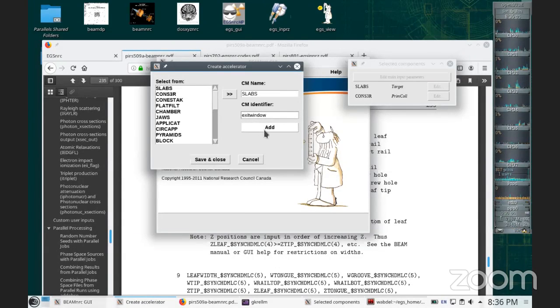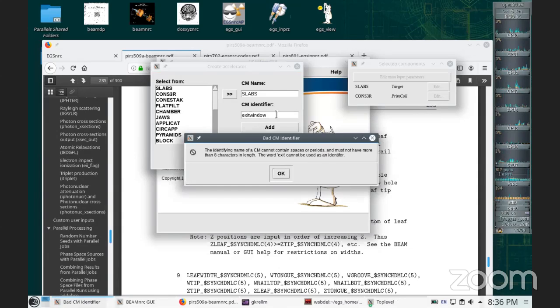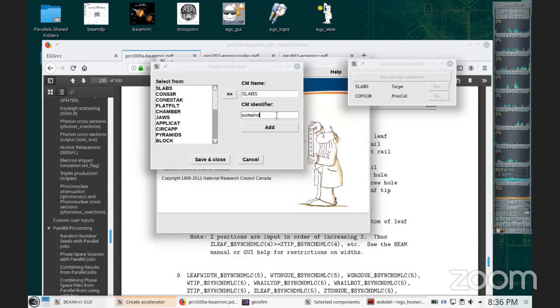Doesn't matter. Okay. Then I'm just going to put the jaws. Oh, slab. Okay. Slab, slab.